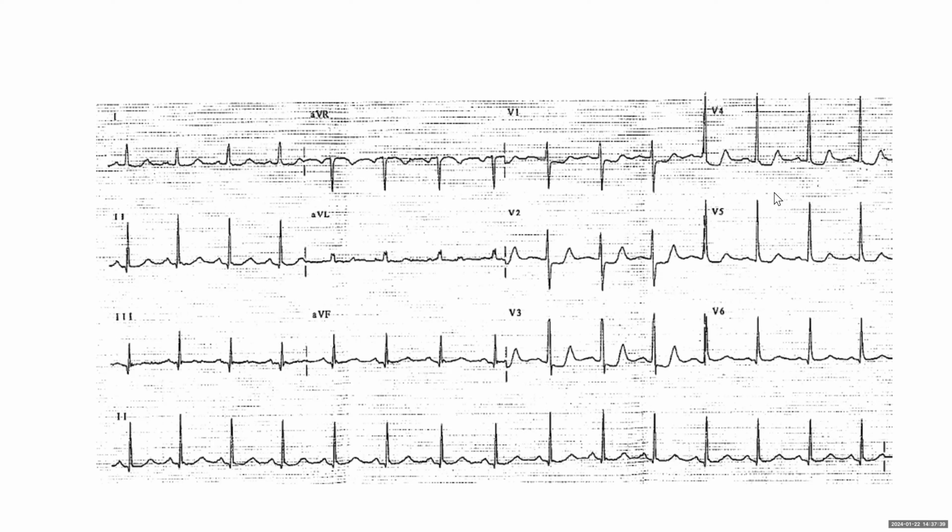You guys are thinking about this because of the prominent R wave in V1. This prominent R wave, what's the mechanism of it? Ischemia. Yeah. Exactly. Posterior Q, mirror change of Q. So I wouldn't say RVH.